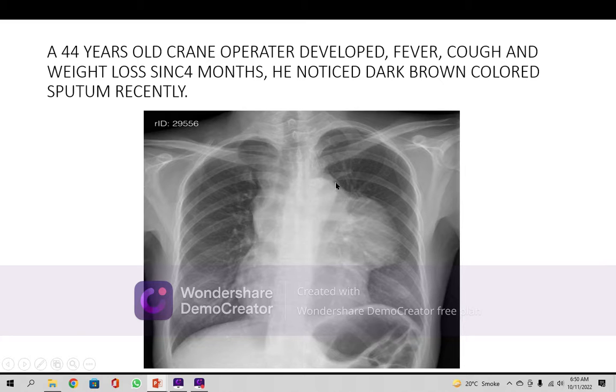Nothing is seen here. Rather, look, this opacity's margin is going outwards, moving here and here and here, and going up parallel to the trachea. Big opacity. This is the upper mediastinum, and this is the lower mediastinum. Some part is visible, although later we will show it clearly. It is the anterior, middle, or posterior mediastinum, but most likely it is a middle mediastinal shadow, and a big mass is there. This mass may be a possibility of acute inflammation. No, it is less likely. What about chronic inflammation? That is, tuberculosis must be excluded, although atypical.